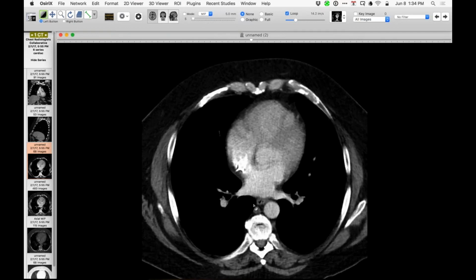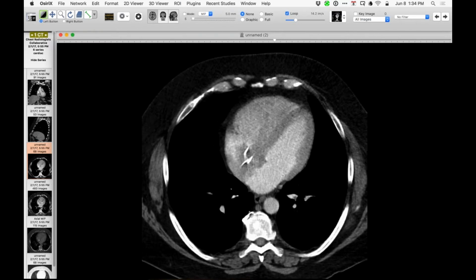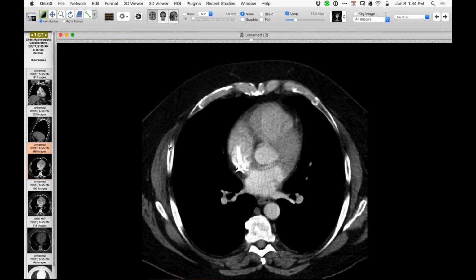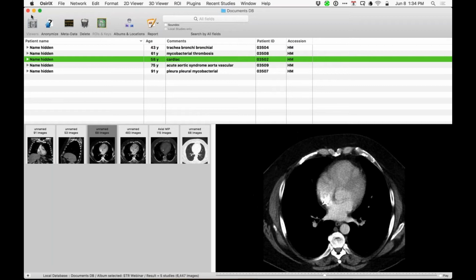By location, I think that's the most likely thing, a bit of scarring and dystrophic calcium, particularly since it's so discrete and localized. I think you're right, and the left atrium otherwise looks normal. The mitral valve looks normal. Those guys are dangerous. I think he had more than one ablation for sure. I don't know how many, but more than one, they said.